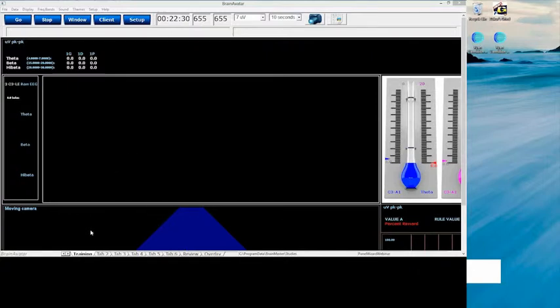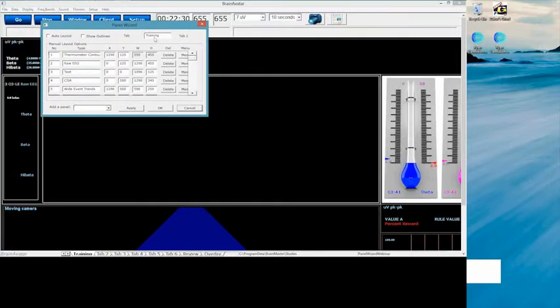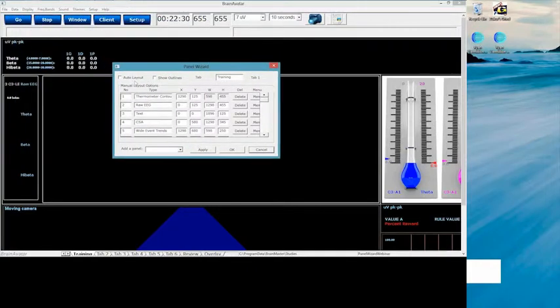How you get into the Panel Wizard system is simply by finding the tab that you want to work on and right-clicking on it. That is going to bring up this menu right here. As you can see in this menu, there are a bunch of different options. The first thing it's going to do is tell you what tab you're on. Our tab down here we named Training, and right here we're on Training. And then it's going to tell you even further that it's on tab 1.